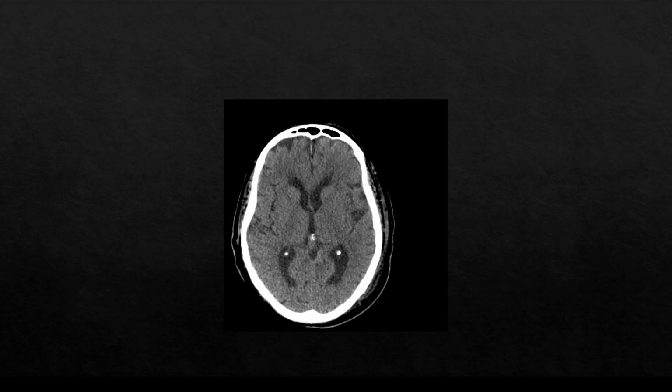Here we have a more subtle case, an older patient with altered mental status, specifically somnolence. This is a subtle finding, but very important to review this on all your imaging. If you look at the posterior parts of the lateral ventricles, the occipital horns of the lateral ventricles, we see abnormal material, which demonstrates attenuation slightly above that of gray matter, almost at gray matter. When we see this, we want to think about differentials such as pus, abnormal bacterial cells in the ventricular system, tumor cells such as leukemia, or blood products.